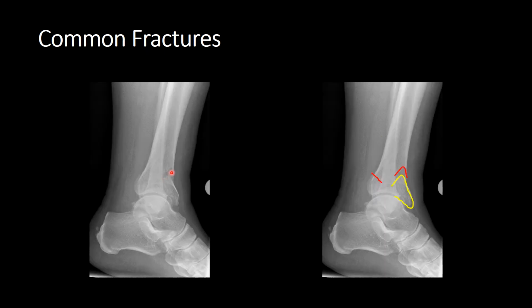And now on the lateral view, we can see how it's been displaced anteriorly. There's also a horizontal fracture running through the posterior malleolus. You can see the gross soft tissue swelling. This dark black area is referred to as Kager's fat pad, and essentially what's happened is that you're getting obliteration of the fat pad due to the large effusion.